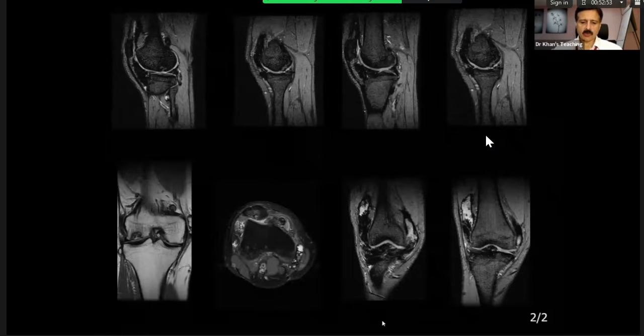Okay, let me show you a viva type of case.